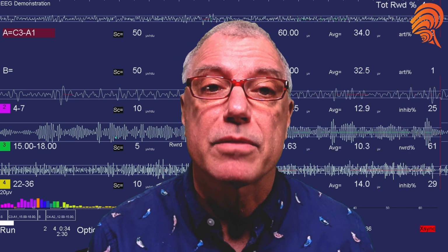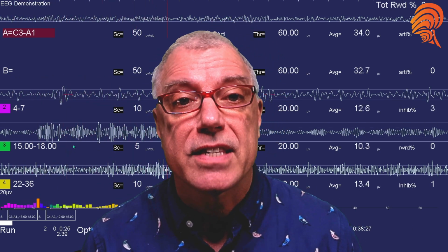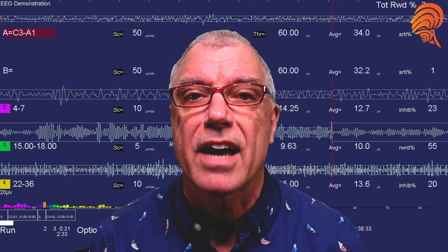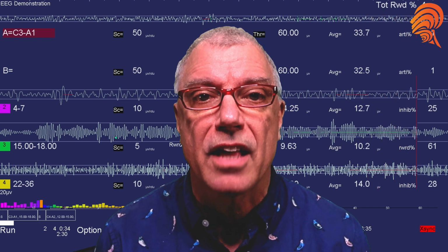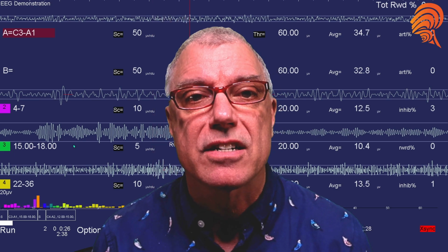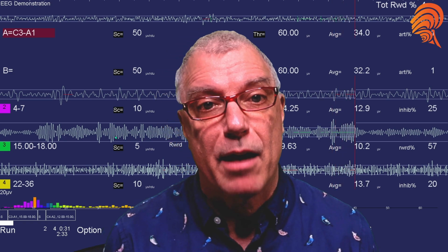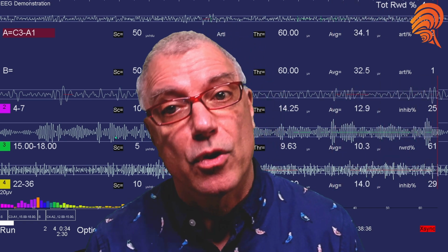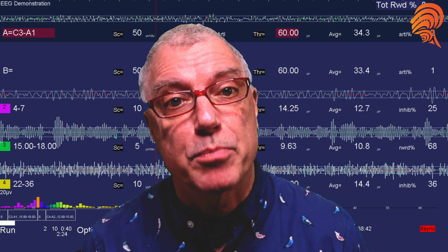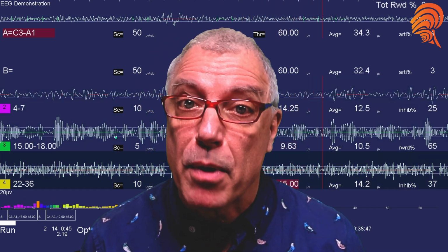But now you've seen EEGer's powerful replay session function. We've just looked at the sample data. Once you're running live sessions, you'll have more choices. And because EEGer diligently records not just the session data, but the key presses used by the clinician in the live session, you can play this all back later. After you've completed a session with your client, you can literally replay the entire session exactly as it happened. This is more than just watching a recording. You're seeing the actual signals that were acquired by an amplifier of a person's brain waves, along with the filter bands, the artifacts, thresholds, and response to feedback.